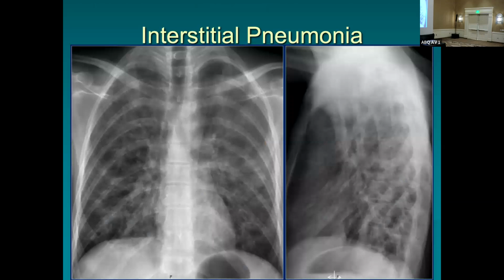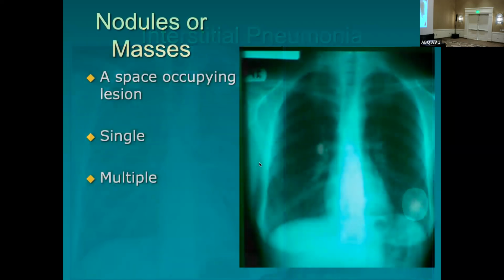Okay, here's what an interstitial pneumonia will look like. Through here, you can see it pretty much all through the tissues on both sides. You can see that it's really cloudy in appearance. You can see the sulci down through here, so it's not failure, fluid backing up all the way, but it is a pneumonia because, again, it goes through all the lung areas in all the lobes.